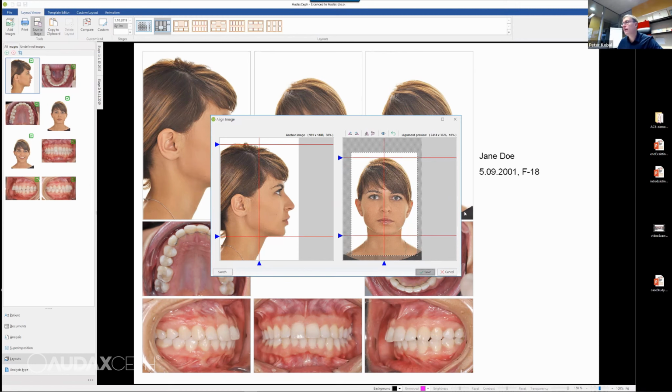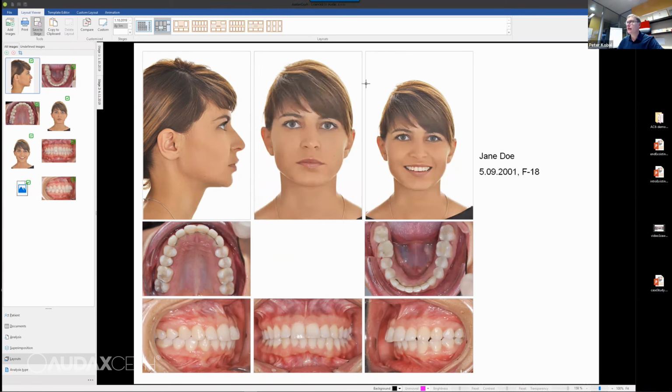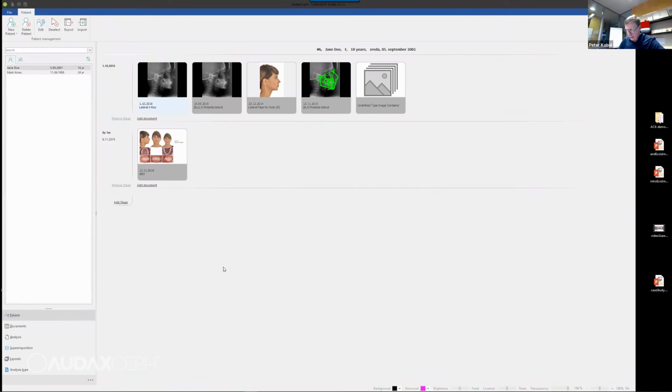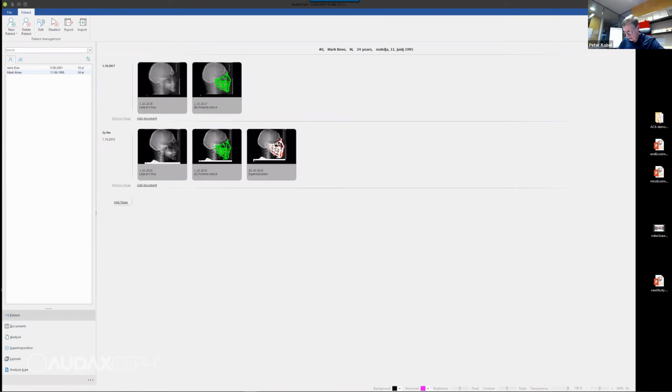And when I save that, this image, which is now seen here, will appear in this frame, so it's bigger. Now, if I can save that to the stage, so that in the documents, it will be seen that on the stage. So it's really very quick. Then the patient, we can have a superimposition. I have that new one.